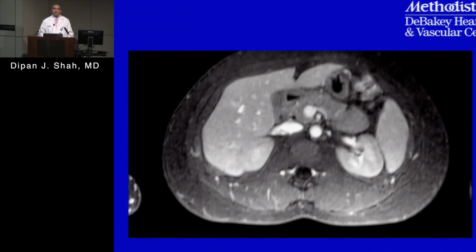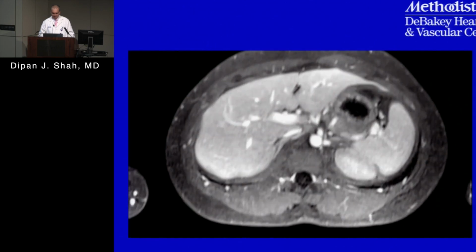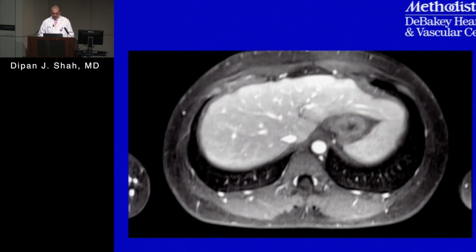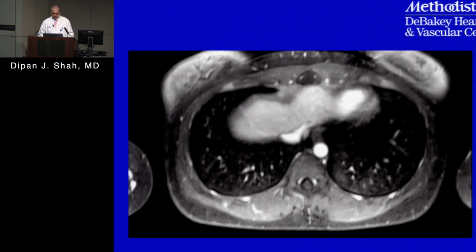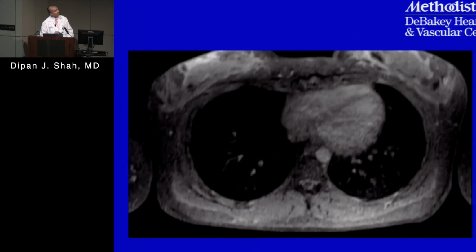Yes, Faisal. If you look at the heart, the septum is black. In the heart, let's see. Yeah, it's hard to say because remember, this is not a gated acquisition, so it's hard to say too much about the heart.